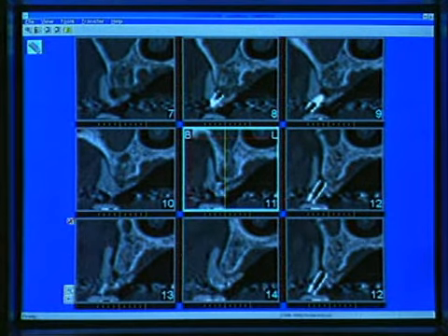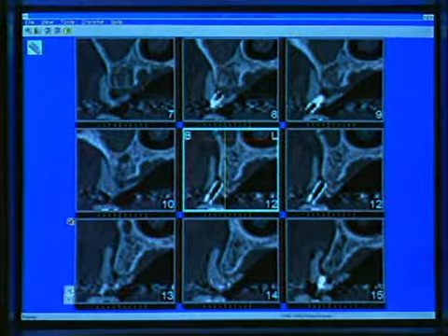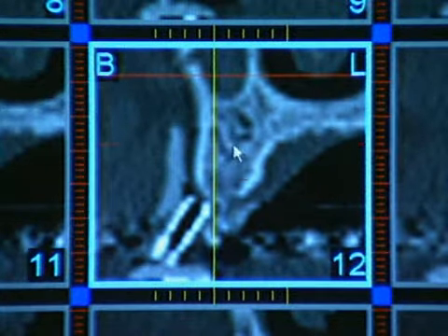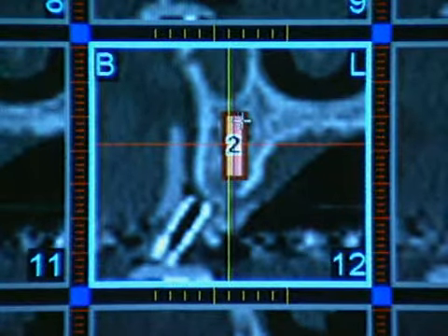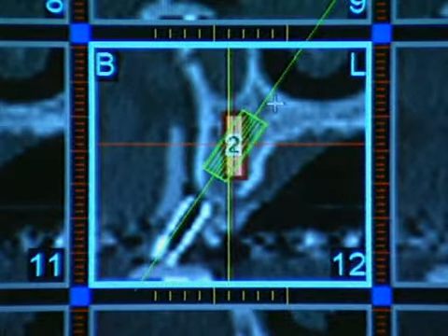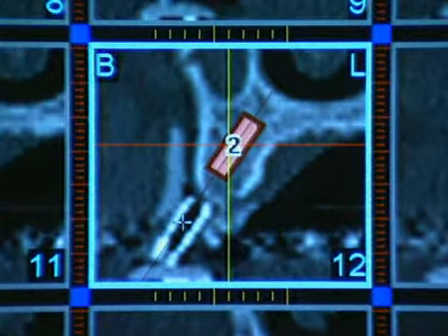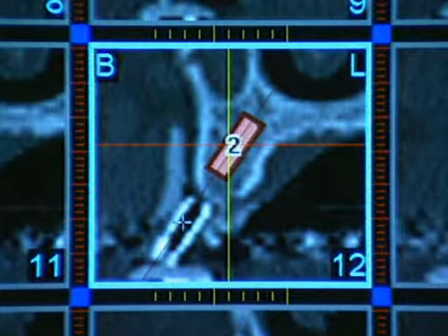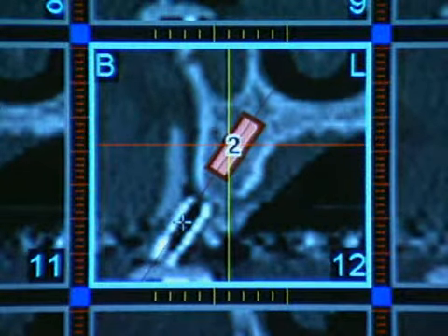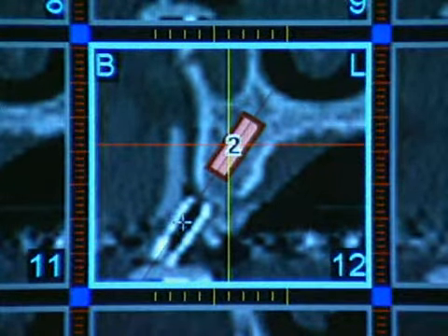Section image number 12 shows a titanium cylinder over the alveolar crest in its correct axial direction. Well-structured additional measurements can be performed via the tool functions. Now, basic implant designs can be selected from a database and aligned in their definitive axial direction. Ideally, the implant axis coincides with the axis of the titanium cylinder. If the titanium cylinder is not correctly aligned, the angle at which it deviates is measured. In this way, the titanium cylinder can be adjusted in the planning template to its correct axial direction and can be used as a template for the surgical procedure.